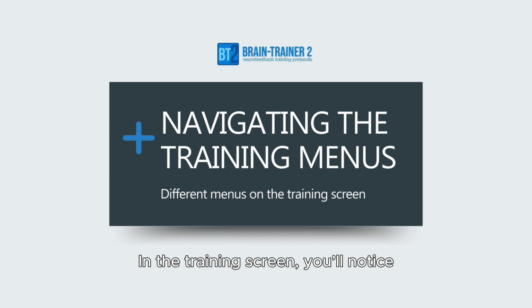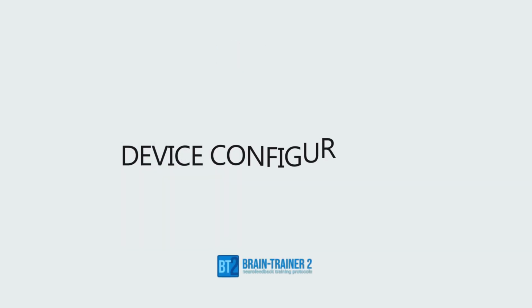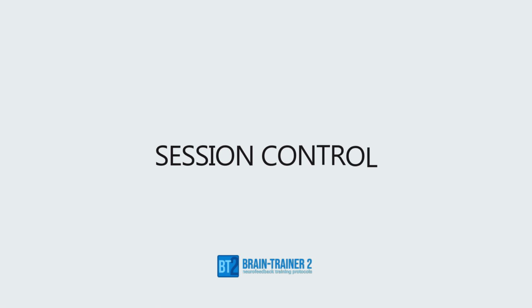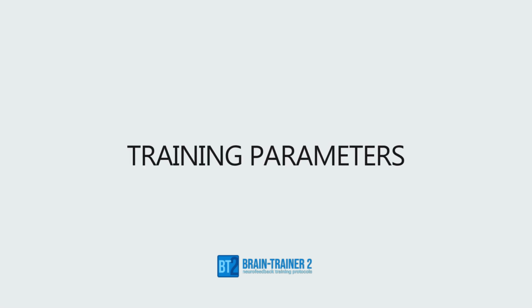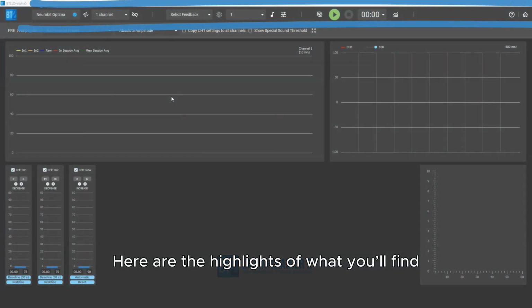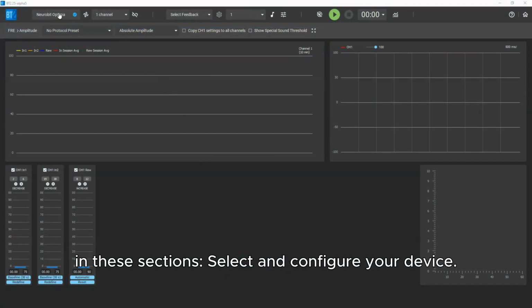In the training screen, you'll notice the menu is divided into 5 key sections. Device configuration, feedback configuration, session control, training parameters, navigation buttons. Here are the highlights of what you'll find in these sections.